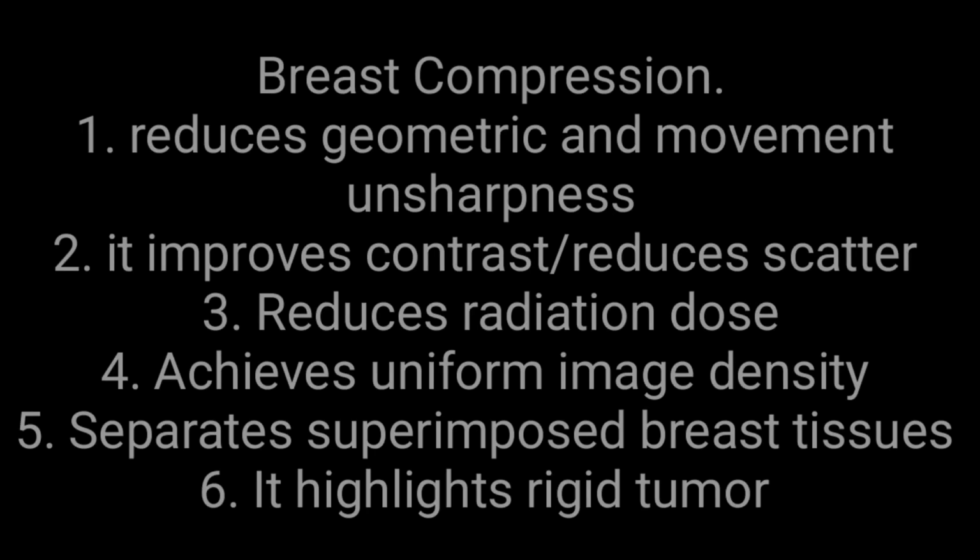It also highlights rigid tumors. When you compress the breast, as I mentioned earlier, the soft tissue and fatty tissue would be split aside, and it will help the rigid tumor to appear clearly. So glandular tissue is compressible, and you can easily look for the rigid tumors on the mammographic images.